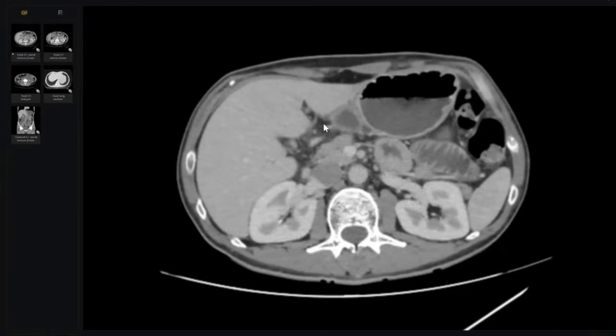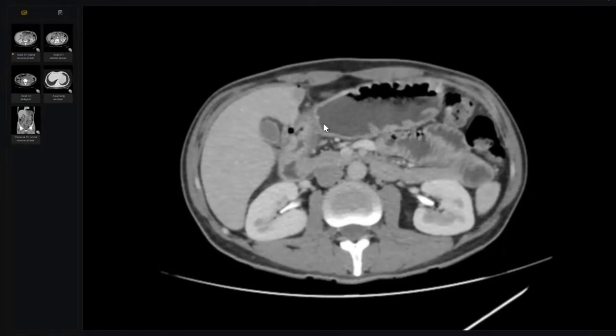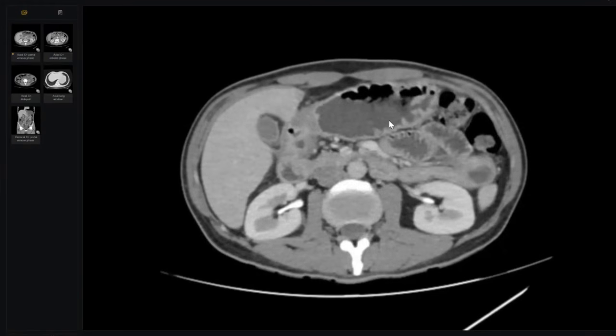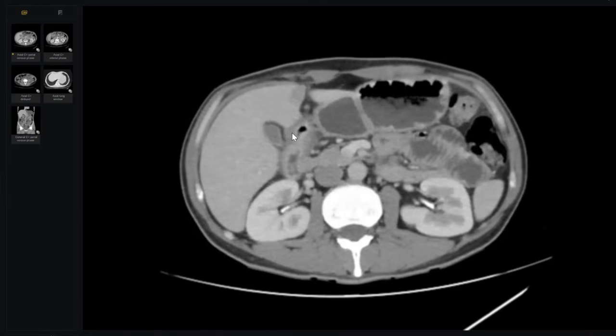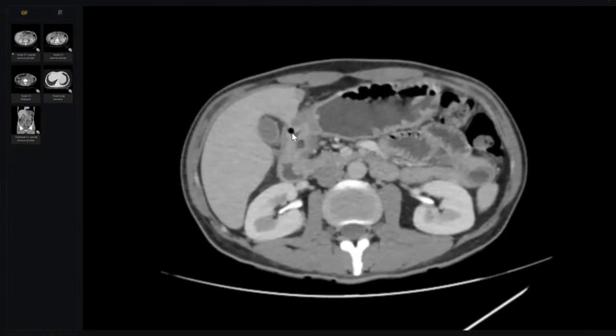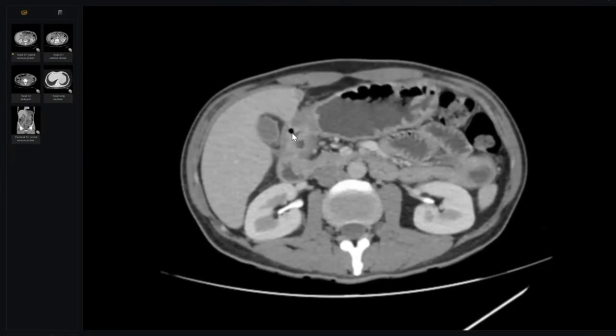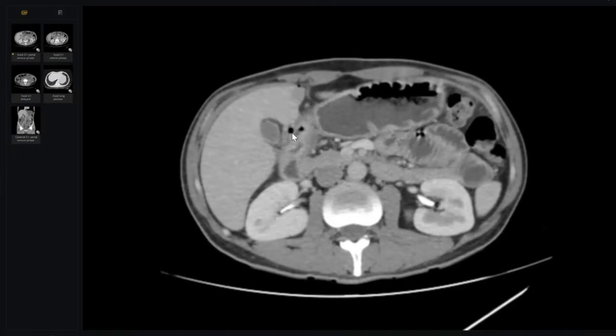Second point, you did very well, doctor, when you searched for the most common site of perforation. What is this? This is the stomach, this is the antrum, and this is the site. You can see the antrum-first bulb junction. In axial you are not totally aware of the exact anatomy. If you told the examiner this is the first part or the distal part of the pylorus, acceptable. Anyway, this is the site.